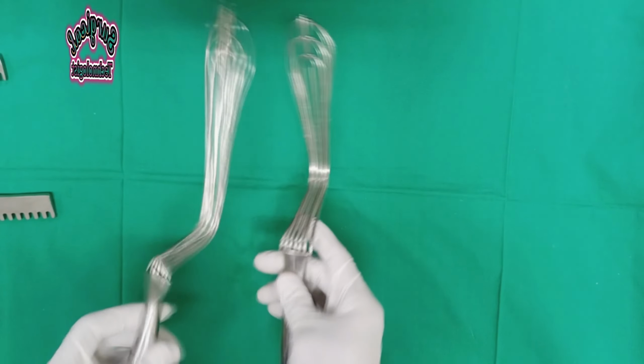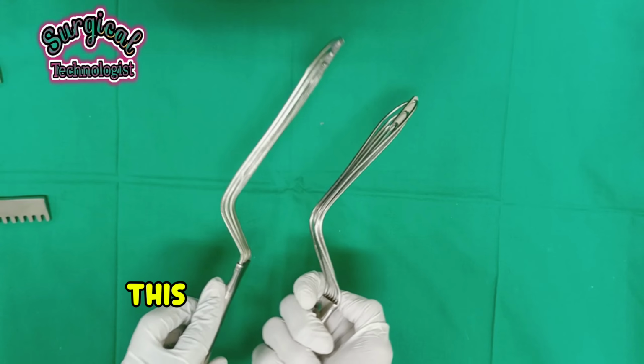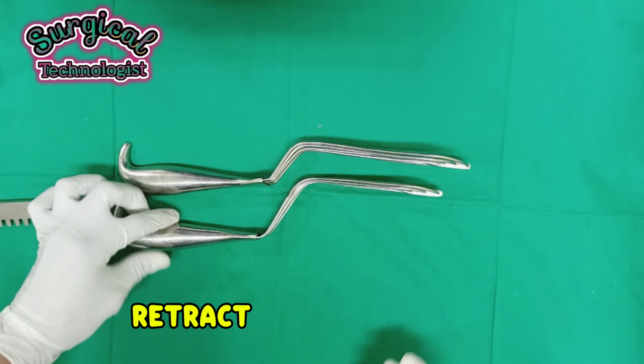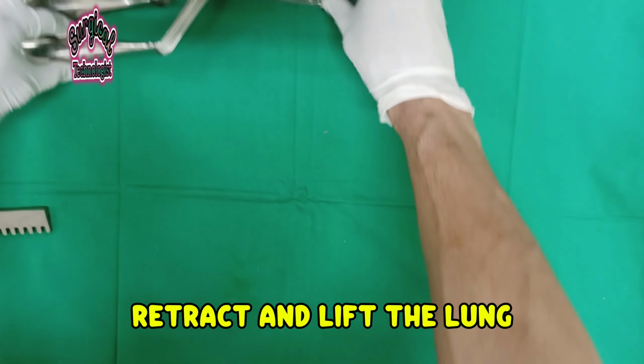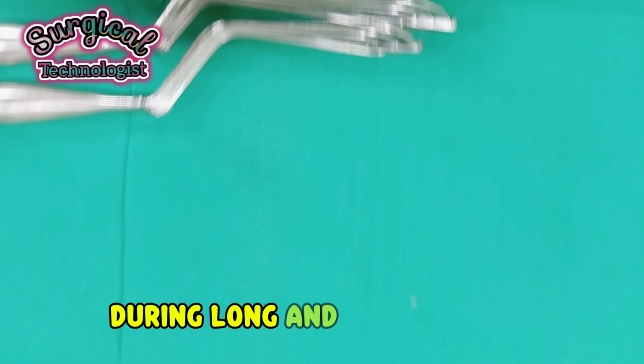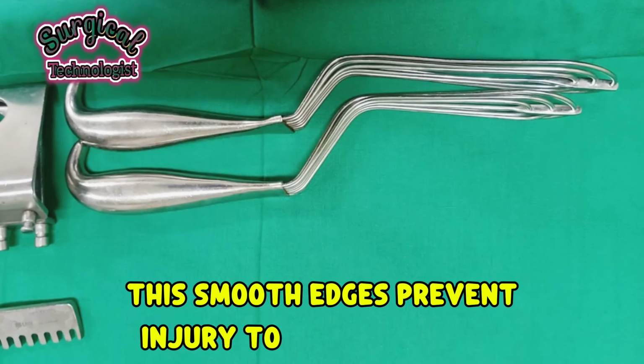Alright. The next instrument is the Allison lung retractor. This is a specialized thoracic instrument used to hold, retract, and lift the lung. It creates a clear and stable field during long and deep surgery. Its smooth edges prevent injury to delicate tissue like the lung.